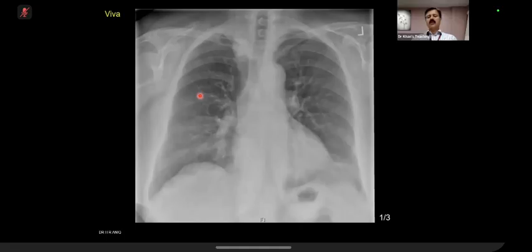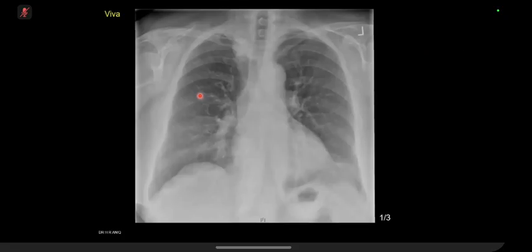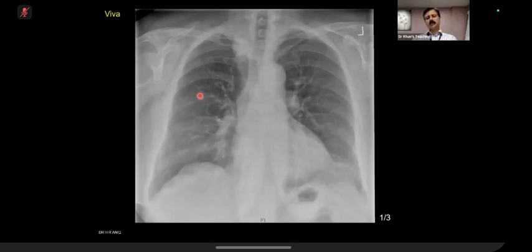Is it in the anterior mediastinum? Is it in the posterior mediastinum? Where is it? So I think the cervicothoracic sign is positive. And what does that mean? Well, that's the bit I can't remember.